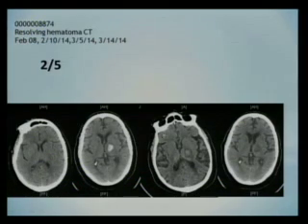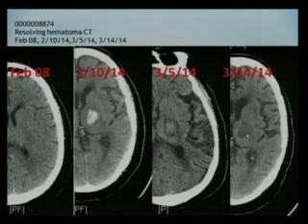This can be confusing because it shows you a ring-like lesion here. And when you say ring-like, invariably you think about something malignant, even though that is usually associated with ring-like enhancement. Nevertheless, it's good if you have old films, and if you follow it up, you can see it's nothing much but a hematoma that just evolved and then slowly disappeared.